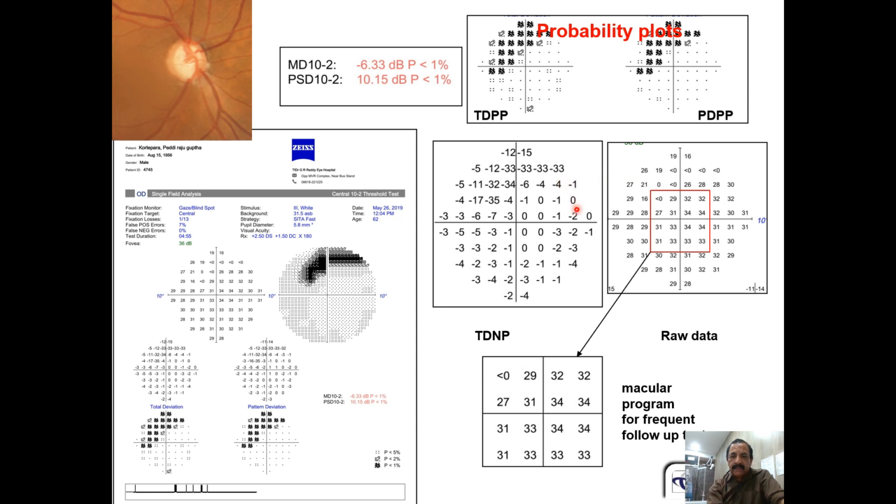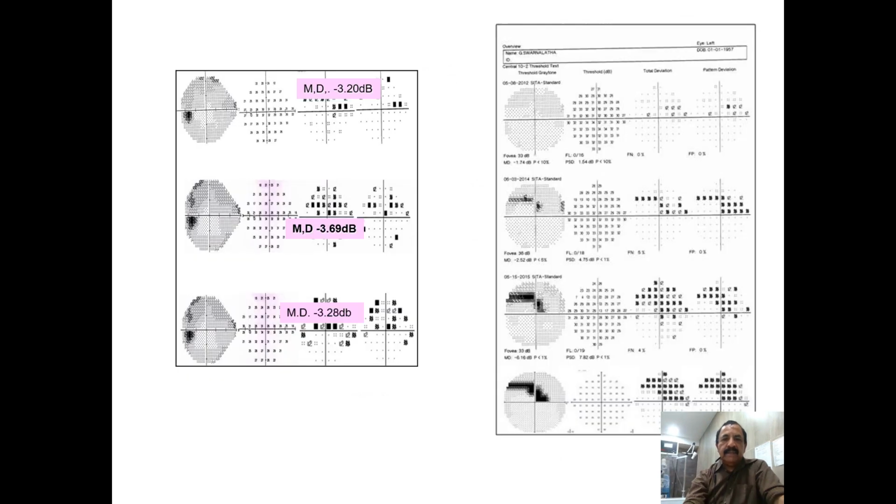But luckily in this patient, the progression is not towards fixation. Luckily it is away from fixation. Since the pressures in this case are 21, and the pressures must be kept around 15, we should see that both the fields in 24-2 and the fields in 10-2 are stable, and we have to analyze the visual fields 10-2 and 24-2 in the follow-up tests in this case.